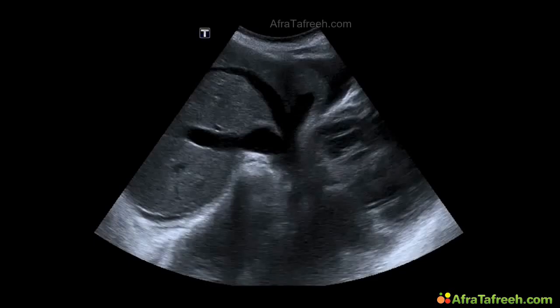Now, let's talk about what liver congestion looks like in our ultrasound pictures. In this picture over here, you can easily see that the liver veins are widened and also the confluence of the liver veins is widened too. And here also you can detect some small dark area which is free fluid. That means the patient has ascites too.